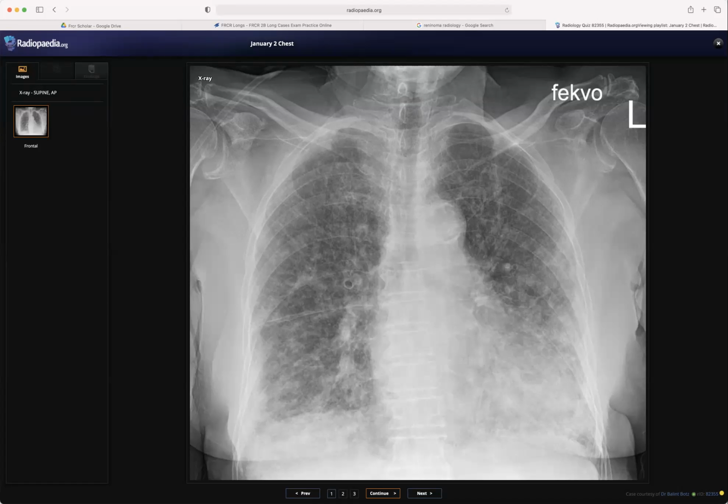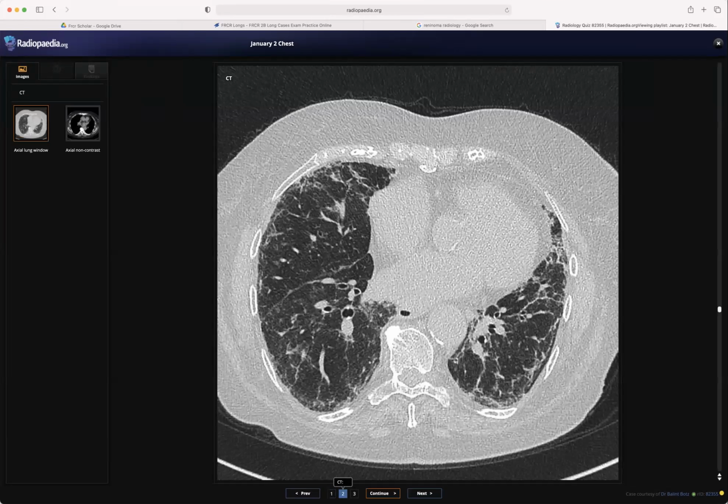So I would like to compare with any previous radiographs if available, and also would like to look at the clinical details of the patient to see if he or she is on treatment for any chronic illness. And then I would like to proceed with the HRCT thorax. Okay, fine. I'll keep the past history for the patient for later.